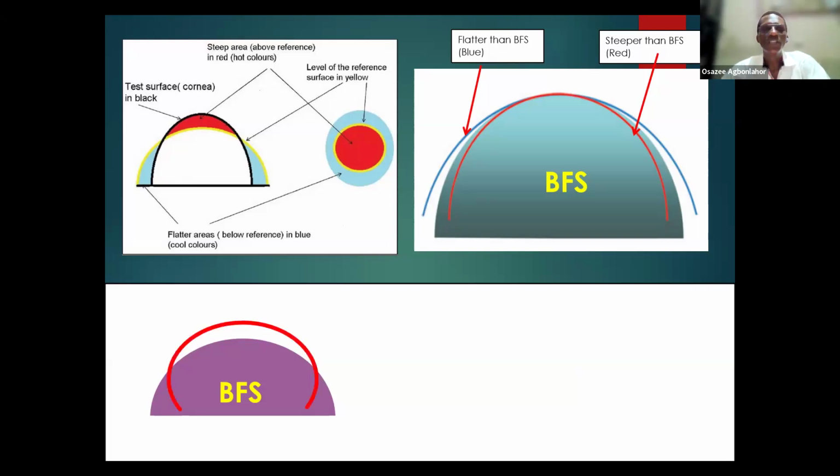All right, so as you can see in this photo here, the yellow lines tell the reference point that this machine has used to classify this elevation map. Anything above this reference line will be seen as elevated, while anything below the line will be seen as depressed, or seen as flat or straight. Okay, so that's what it uses in elevation.